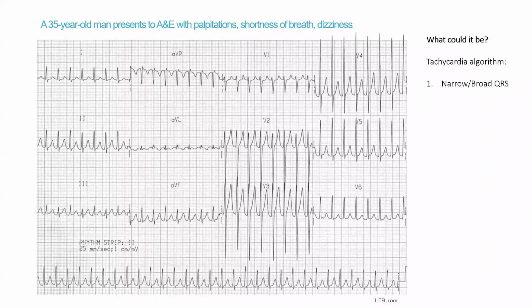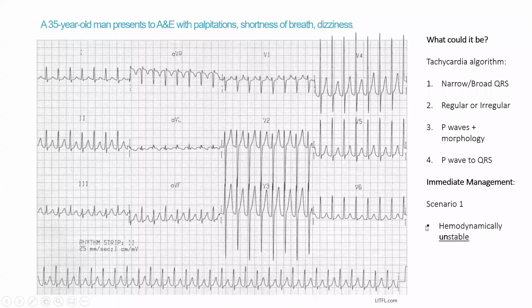Yeah, we're skipping ahead. It's regular, brilliant, we're all catching up. It's regular. Can you see P waves? No, not really. Can't really see them at all, can we? P waves, QRS? No. So we need to slow this down.